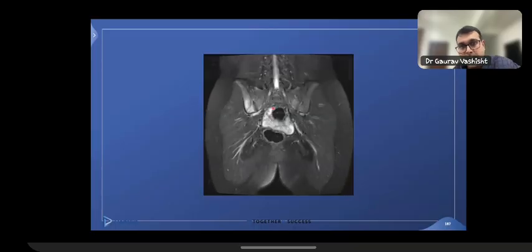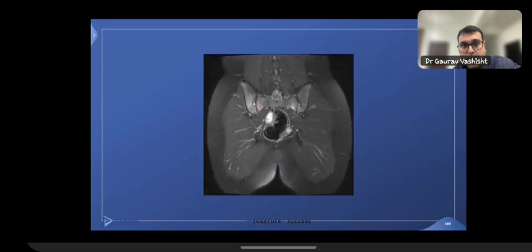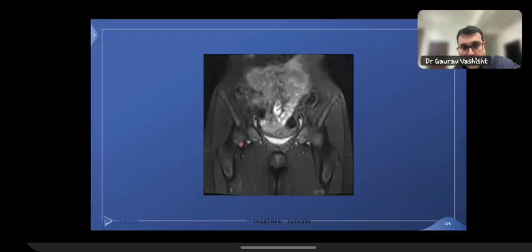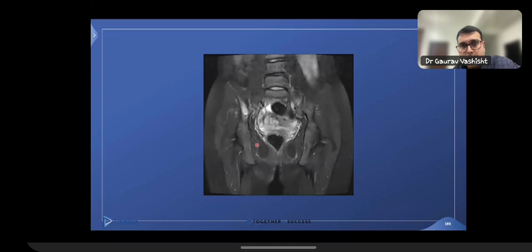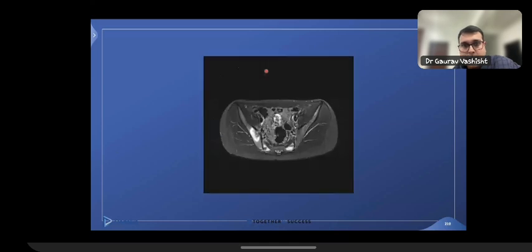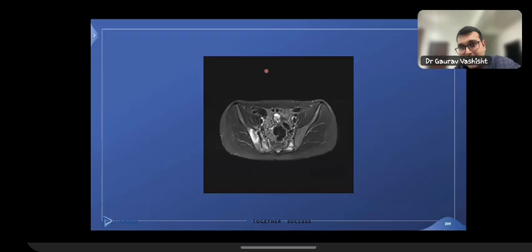So we could see that there is sacroiliitis on both sides, mild right sacroiliac joint effusion, okay, and the rest of the pelvic bones, the femoral heads, the trochanters, the pubic bone, the ischial tuberosity, everything looks perfect. The visualized vertebral bodies are fine. So this was an idea of showing you how whole body MRIs can also identify multiple pathologies at multiple sites.